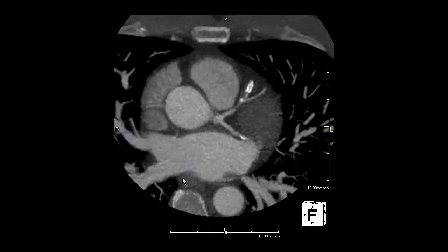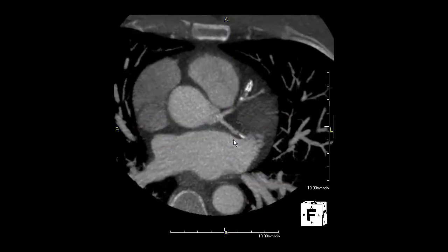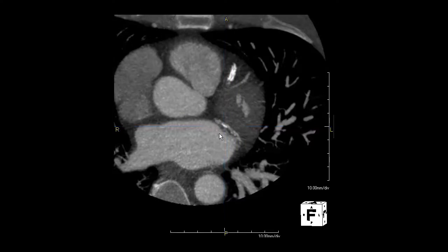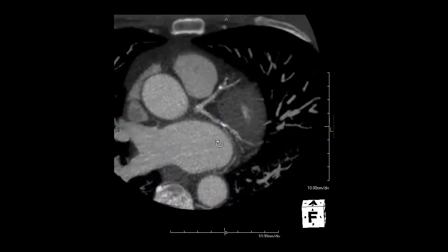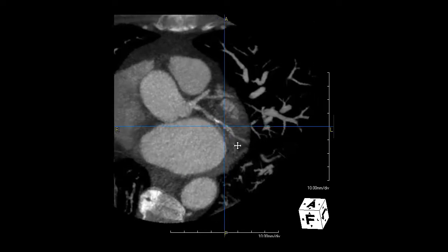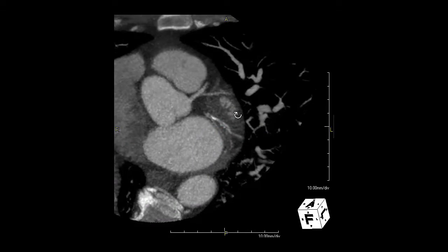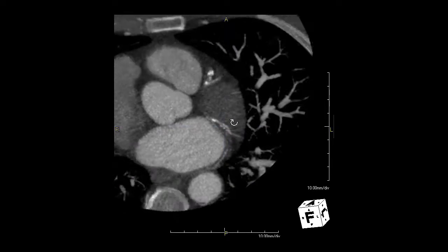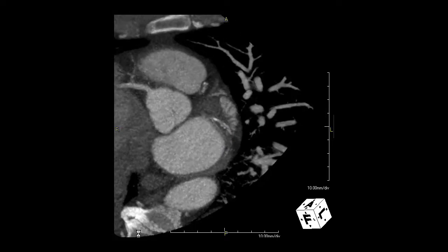We continue our coronary review, looking at the left circumflex. The proximal segment of the vessel appears to be generally normal. However, as we move down into the area of the obtuse marginal in particular, there is eccentric calcified plaque, and further down in the obtuse marginal, there may be some complex plaque, which appears to be at least borderline for obstruction. The vessel itself, however, remaining body of the left circumflex is very small and difficult to assess.